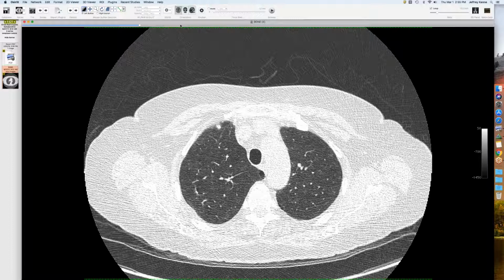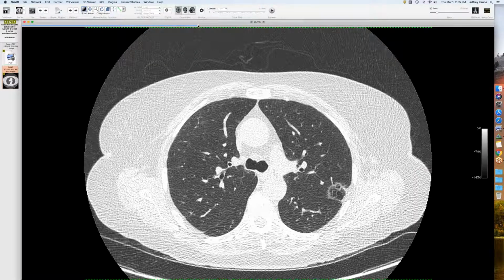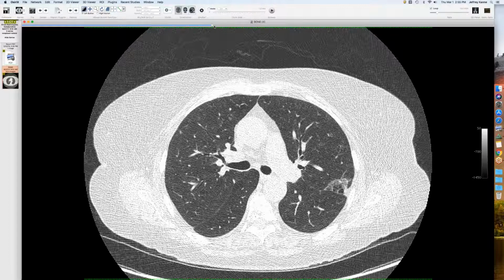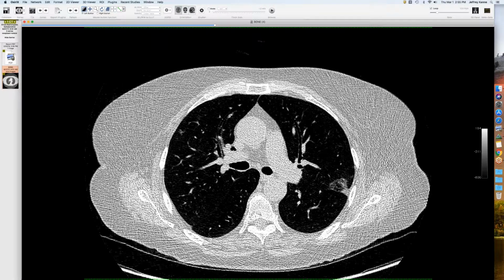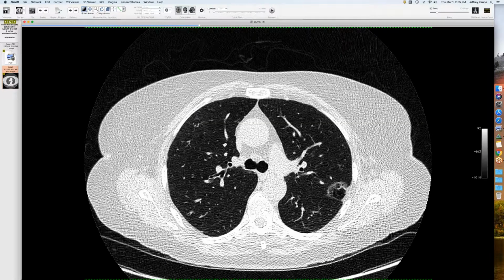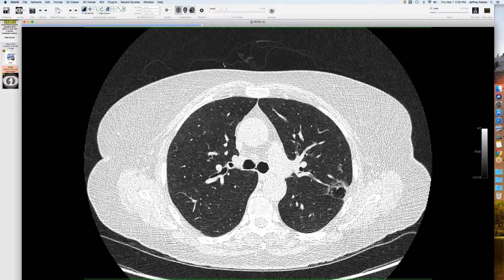Yeah, two points. I'm glad you said. Go ahead. I was going to say, I'm glad you called it a 4X, because we had one very similar yesterday. The solid component was a little bit bigger. The amount of cystic stuff was smaller, but it was still a mixed lesion that doesn't really fall into any good category. Because if you only measure the solid component, it was going to be like a centimeter, but I called it a 4X. Right. Because it's similar to that.